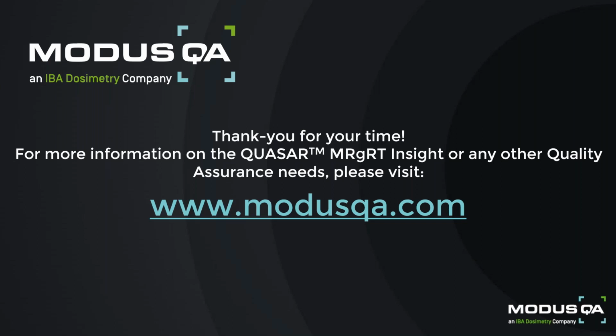There are quite a few differences between that one and this current Insight, despite both being able to characterize distortion. The first is that the MRID 3D Phantom is a highly specialized phantom. It's really designed for, first and foremost, a highly precise sub-millimeter accuracy 3D geometric distortion assessment for the majority of your treatment field. It uses a really innovative and proven distortion detection method that, when you pair it up with the software, allows you to not only assess your entire system's overall distortion, but also quantify and separate out your B0 and GNL distortion.